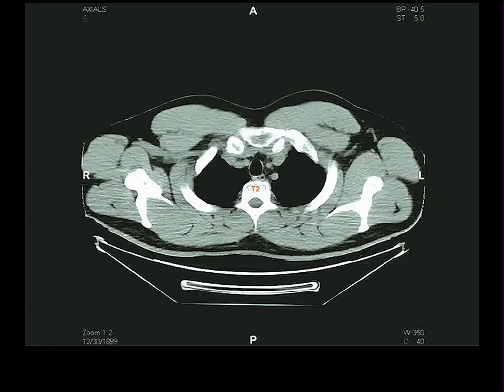This person's first rib on his left side is just about to join in the joint it has with the manubrium. On the right side, this person's first rib is still pretty far from the manubrium. That's not an anomaly of this person. These CT scans are often sort of oblique. It's hard to get a person to lie absolutely perfect so that their long axis is exactly perpendicular to the scanner. There's a little tilt in the person, and you'll see a little bit further distally, further inferiorly on one side than the other. This is quite typical.